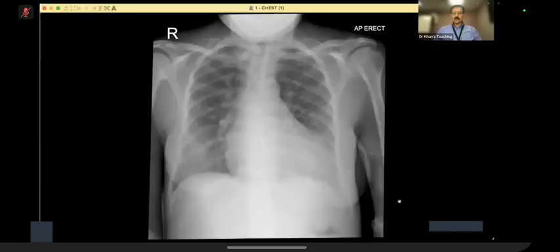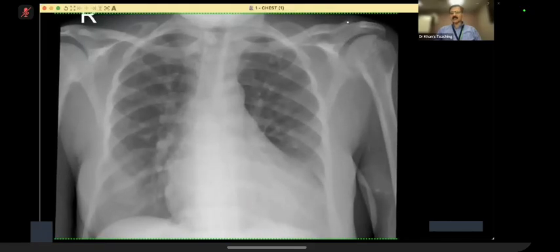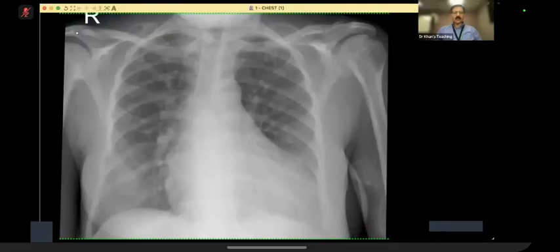It was at the edge of the film, and it's the 'eye sees what the mind knows' type of hypothesis. So you see this? It's a very harsh call, but once you have picked up, then you can see what is happening. Basically, from here to here on the clavicle there is a gap. It is eroded. From here to here, there is a gap. It is eroded.